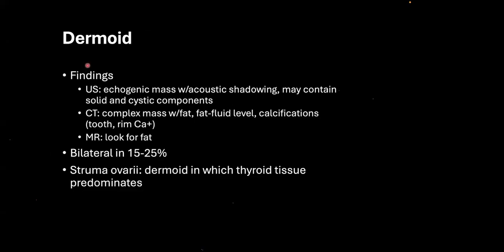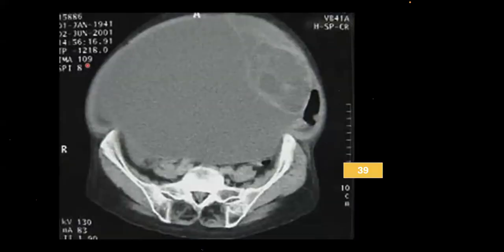Okay, this is typical for dermoid, right? Most of you got this correct. Zoom, which one are you calling as not seen endometrium?